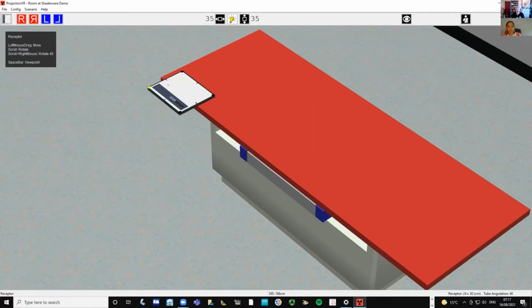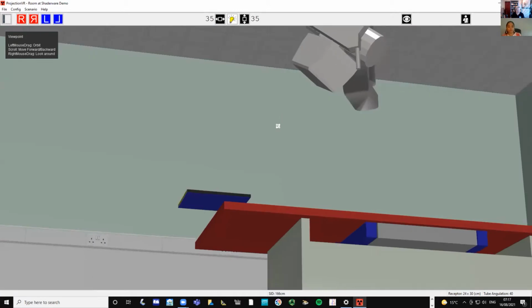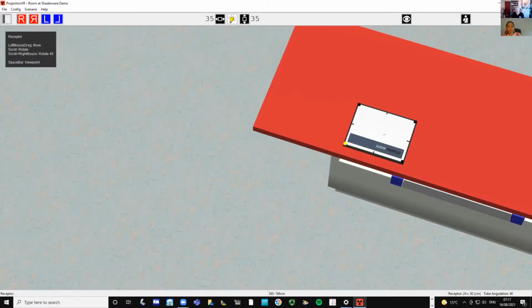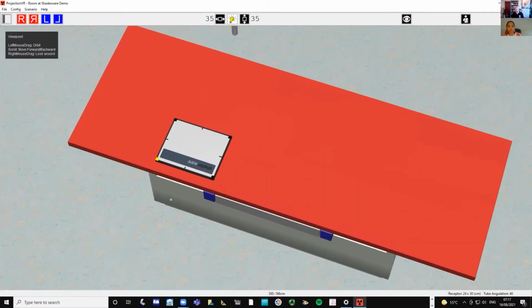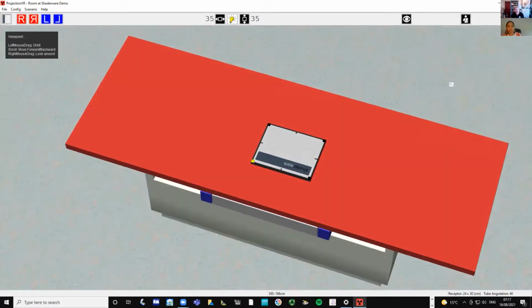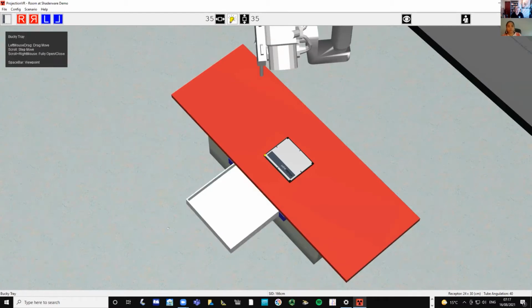They also understand that if you look at the underside of the receptor, you can see that it's blue and it's gray at the top. So they understand there's a side that you can X-ray and a side you can't. They learn all these things before the first clinical placement, which is really good. And they learn by doing, which is really good as well.